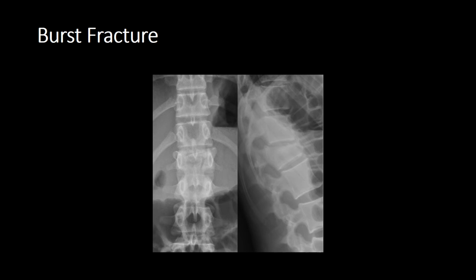Now let's look at our pedicles. And here we have diastasis of the pedicles. And the best way to check that is by looking at T12 and L2. So we have widening of the interpedicular distance. So if we have widening of the interpedicular distance, this means that it's got to have an injury involving the pedicles. Now if the injury involves the pedicles, that's a posterior column injury. So suddenly you have two column injury. This is an unstable injury.